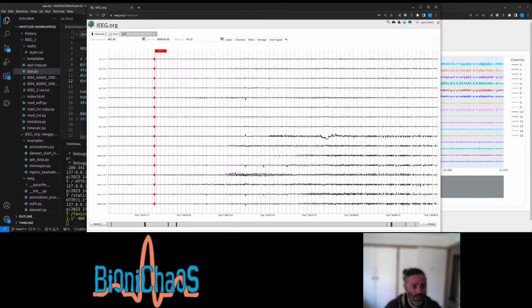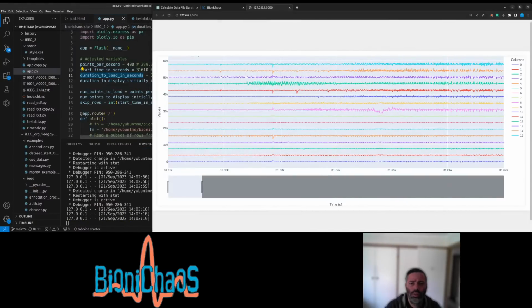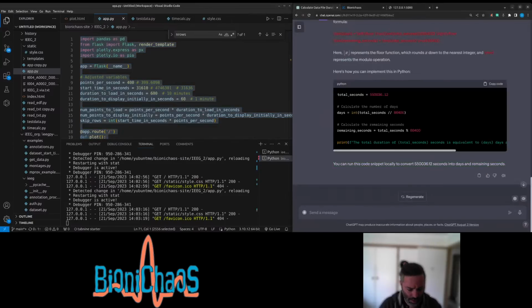Let's change the names. Put it in the same chat.